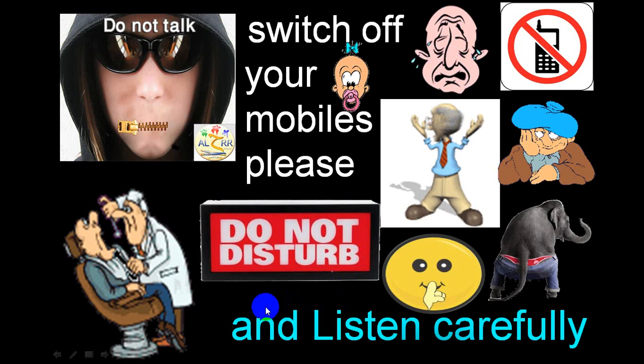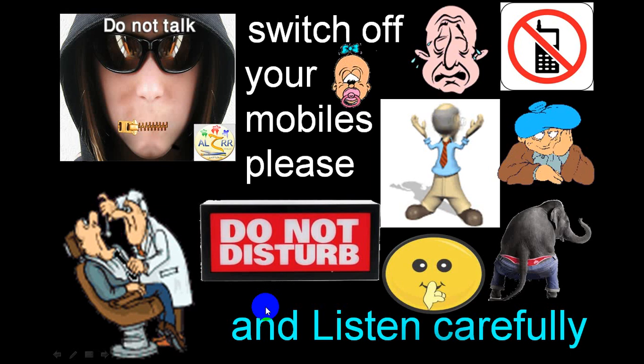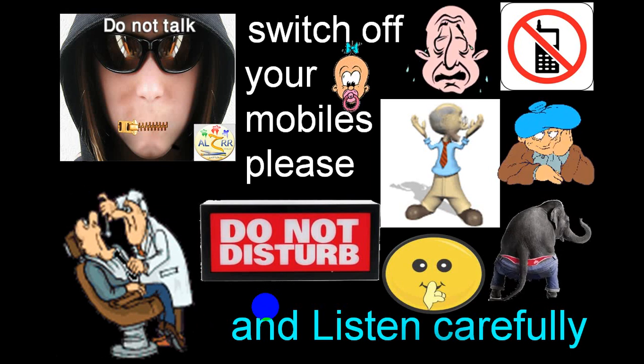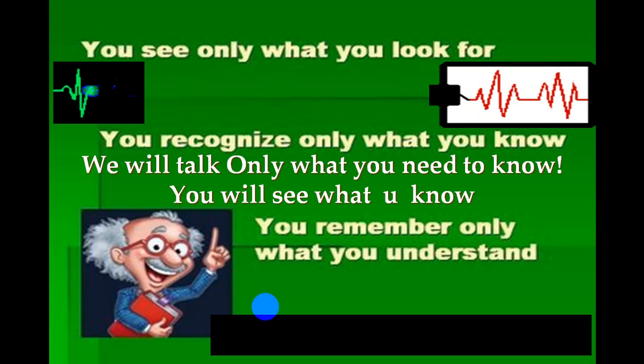Today I'm going to talk. I'm Dr. Janak Patel. Today I'm going to talk on how you examine rhythm in an ECG strip. So rhythm can be examined by examining pulse as well as by examining the ECG strip. But in pulse, you can examine only rate and regularity, but you cannot identify the origin of the pacemaker, which you can do only by examining the ECG strip.